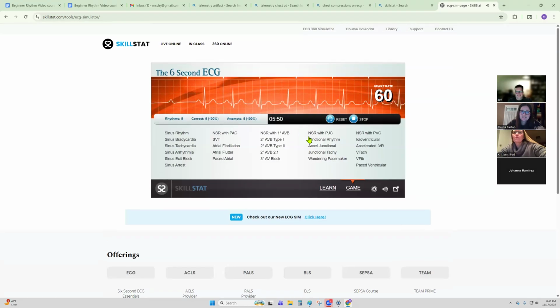All right, Elena. Hold on. I know this one. I have to look at my notes. But I have notes on this written down. The P wave's present, but it's missing the QRS complex. So the SA node is working regularly. Then there's something wrong.